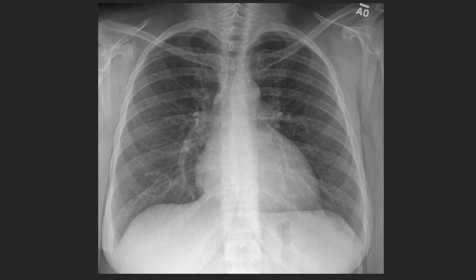So what about our major vascular structures? The first one that we're going to talk about is the ascending aorta. The ascending aorta again comes off the left ventricle, and then we'll go from right to left. When it's going from right to left, notice how its right lateral aspect actually will form a cardiomediastinal contour. That bulge that is sticking out to the right actually forms a cardiomediastinal contour.